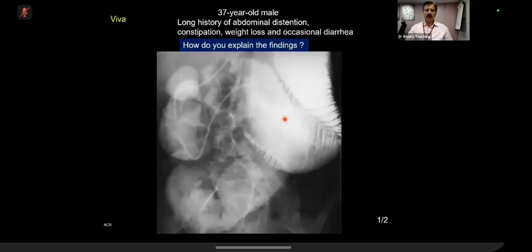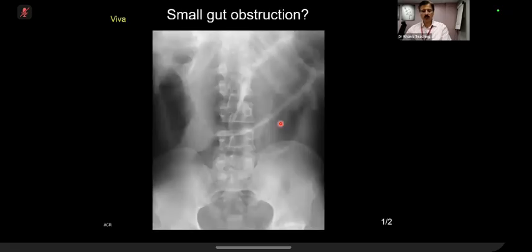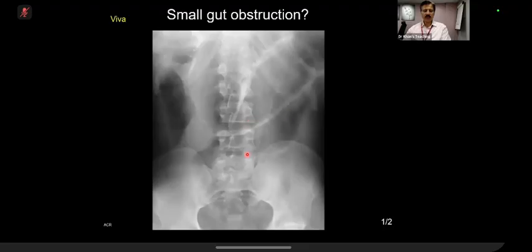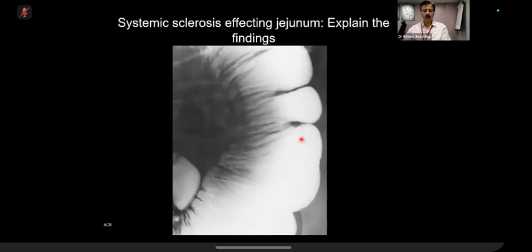The second thing is that, because of fibrosis, there can be outpouching of the bowel walls, and these outpouchings are more clearly seen at times in the large bowel also. So these two findings are pathognomonic for scleroderma. This appearance is known as hide-bound bowel appearance, synonymous with the hide-bound appearance of the skin of these patients, which becomes very hard, just like cattle hide. And the same finding can also be shown on a plain film.